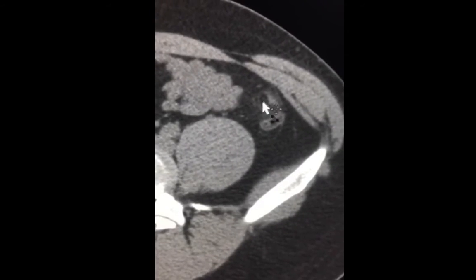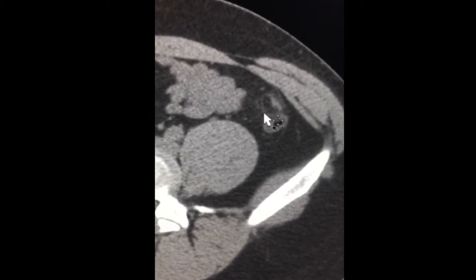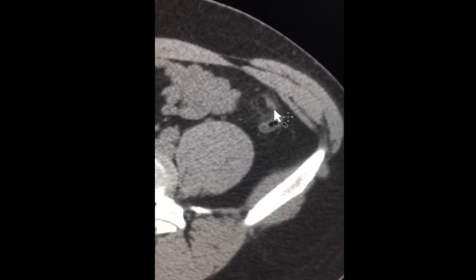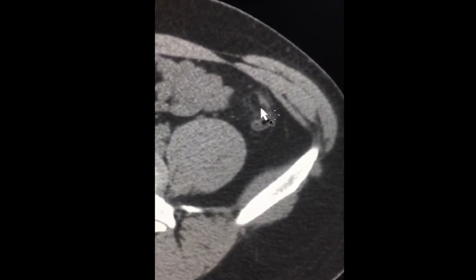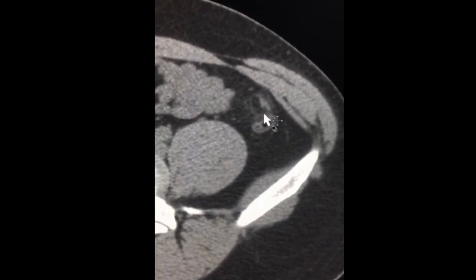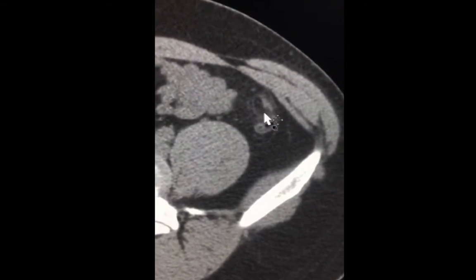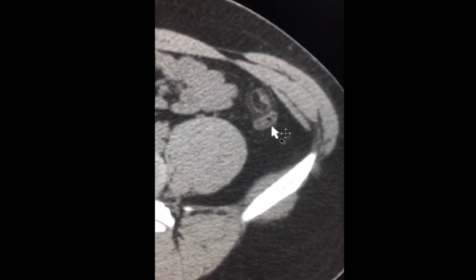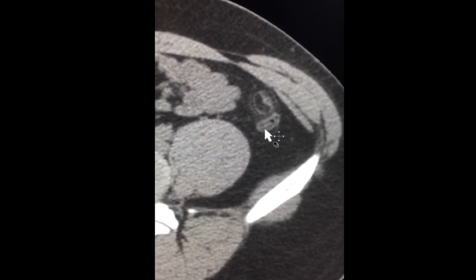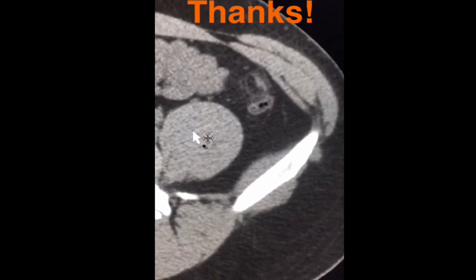However, remember that this neat entity of appendicitis epiploica may confuse you for other abnormalities. Now, appendicitis epiploica has a classic location close to the colon, has a central fat area, and is surrounded by inflammatory changes. Importantly, the wall of the colon in such cases is normal and not thickened, telling you that the abnormality is from outside.